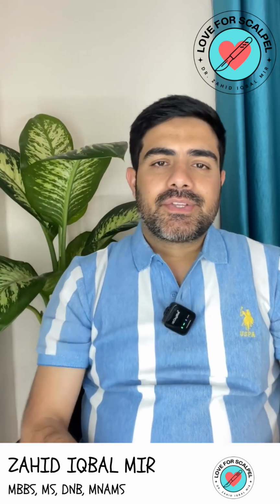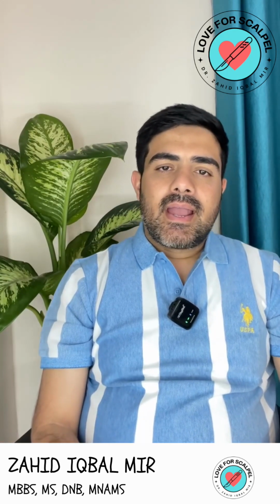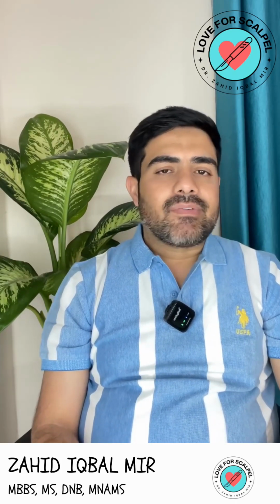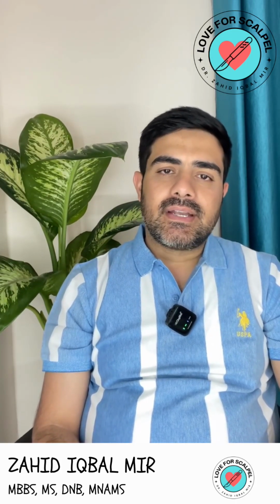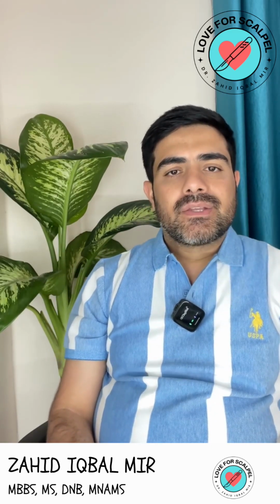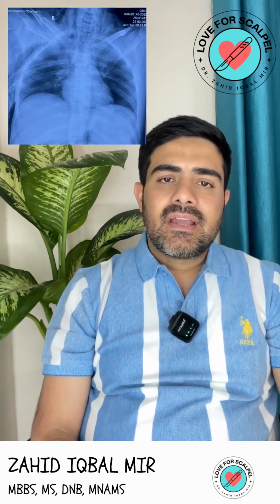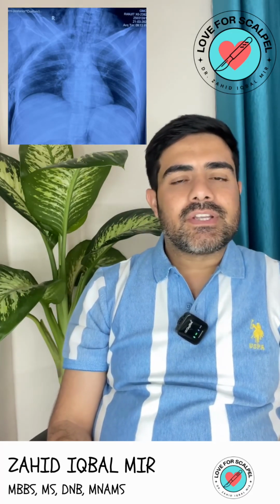Hello everyone. So today we are here with the X-rays of a patient who presented to surgical emergency with history of roadside accident with blunt trauma chest. So we have the first X-ray and we have one second X-ray. So first X-ray is before intervention and second X-ray is after intervention.